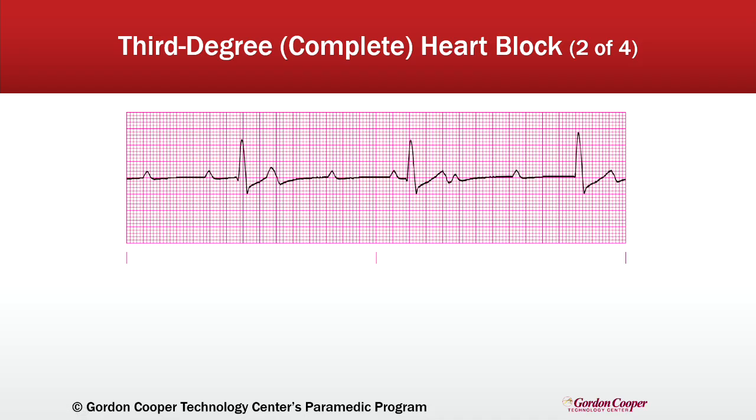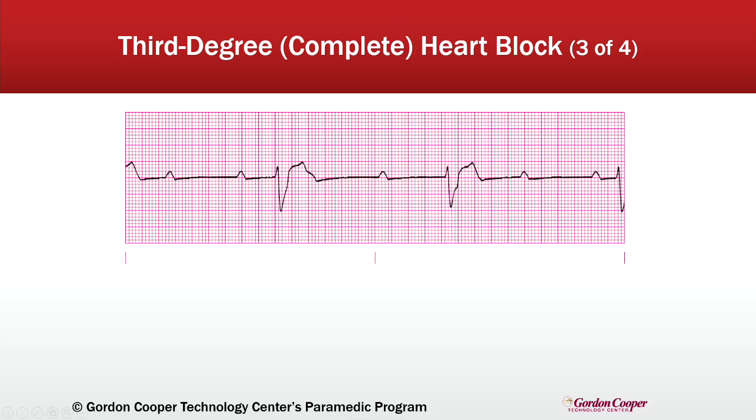So one of the big points that we made was the PR interval. When you look at this PR interval, remember we talked about it being lengthened. We talked about type 1, or Wenckebach, being progressive. Type 2 was constant. This is variable. So you see this much space, then we got back to normal, then we've got all this. So this is a variable PRI.